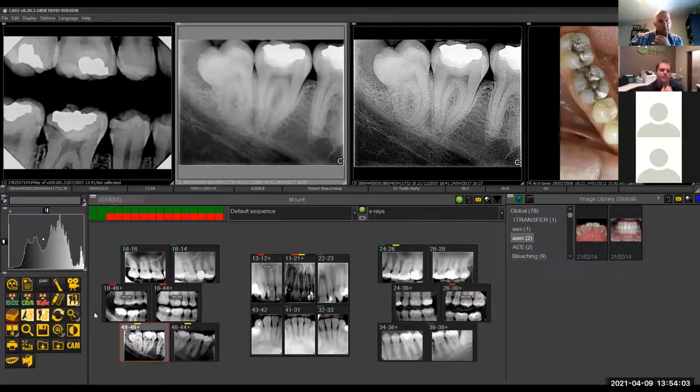Assuming the filters can be pre-saved, so when images come in you can apply the same filter to certain types of images as part of the setup process, as a standardized thing. Yeah, we can actually program it to treat it right away automatically if you like a certain filter.